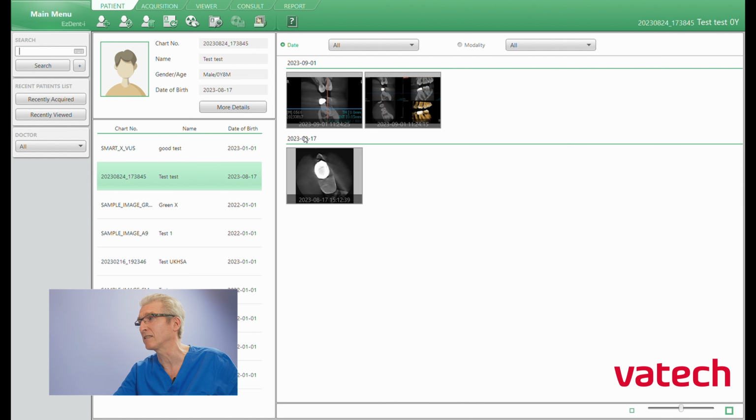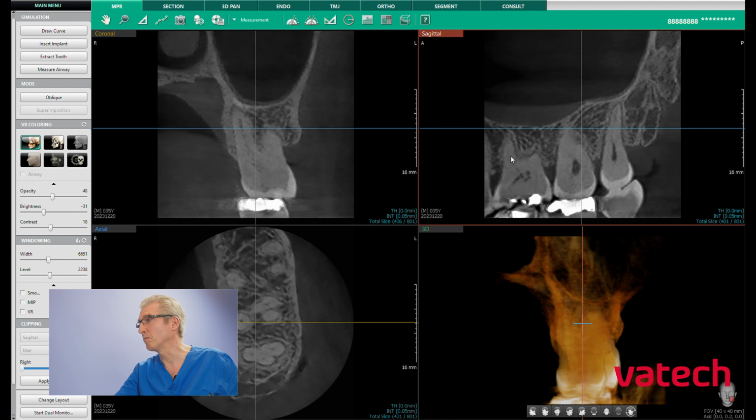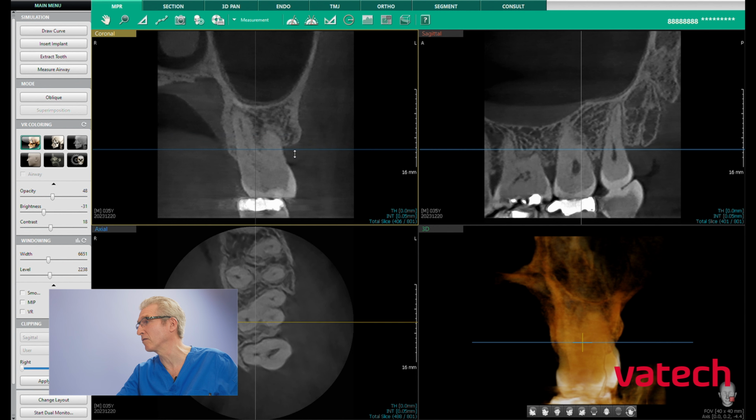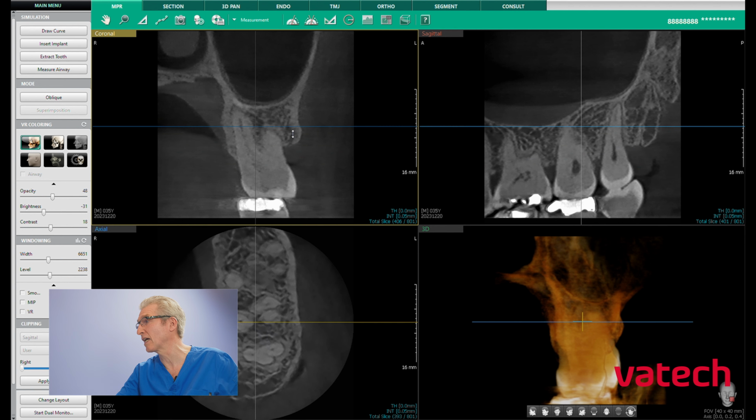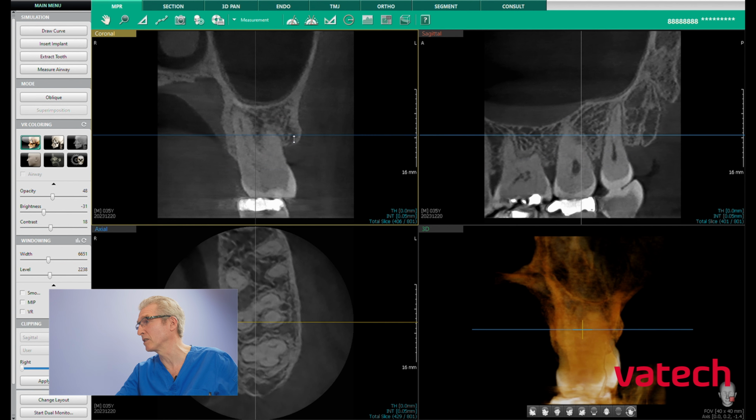even though it's under test, on the other screen we have the EzDent-3D-i. And this is the scan opened up. This is the full scan in process. We've got the different sections from side to side. And just by moving these slider bars up and down means that we can work our way easily and efficiently through our scan. So here we're moving up through the maxilla.